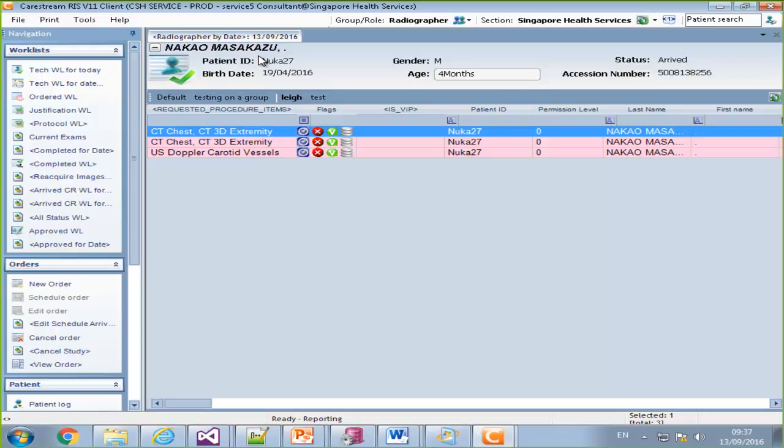So we start with the purpose, which I think is pretty obvious, but just to make sure. Until now, when we wanted to document a study, we could do it only for one study. And if we wanted the data to be copied to other studies, for example when the technologist is doing a couple of studies and we want all the data to be together, you needed to copy it the old-fashioned way with copy-paste.